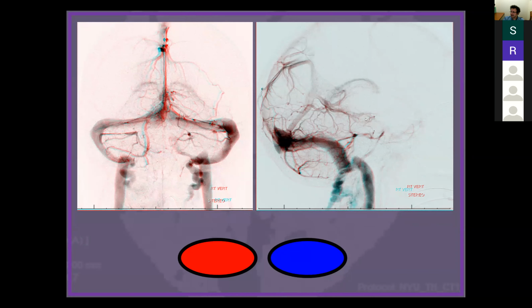So this person doesn't have a big anterior pontomesencephalic vein. You can see the shadow of that. But in balance with that, there is the lateral mesencephalic vein here, which is this thing over here. And here's your interpeduncular fossa, central vein. In the back here, you've got the inferior cerebellar veins. That's the big one over here.